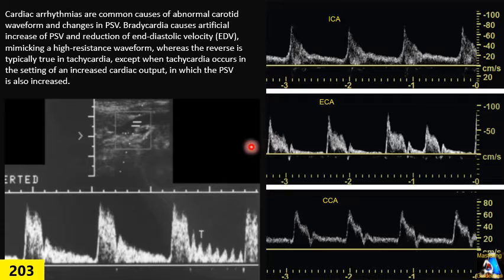Another situation that we have to remember is in those conditions where the patient has significant atherosclerosis and plaque, and based on the color Doppler and spectral Doppler, it's very hard to differentiate whether that one is ICA or ECA just based on the 2D and color, and even sometimes with the spectral shape, because as we will explain later, in stenosis those features change.